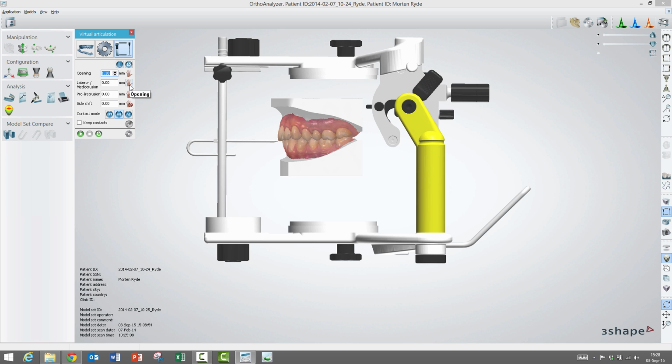If you want the translation movement to go not further than a certain value, then you can set the value here in order to make sure that it doesn't exceed it. This movement can also be locked and unlocked at will, depending on what you are trying to perform. So basically when you click the little hand and there's a stop sign over it, it means that you have locked this into the constraints.